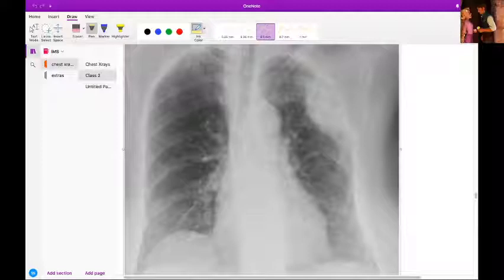Anyways, yeah, what is this X-ray, guys? What do you guys see?